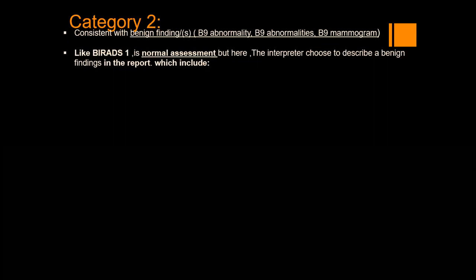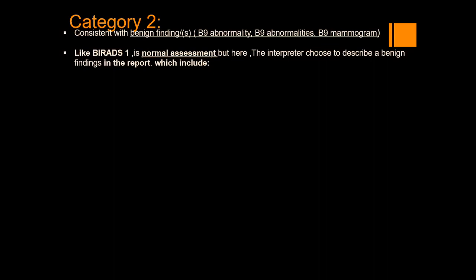Intramammary lymph nodes, yes. Single dilated duct? No, we did not say single dilated ducts. Fibroadenoma that has not changed for at least 2 years of follow-up. Excellent. Stable, presumed mammographic fibroadenoma: probably benign lesions presumed to be fibroadenoma, stable for at least 2 or 3 years. Okay, excellent. It will be BIRAD 2.